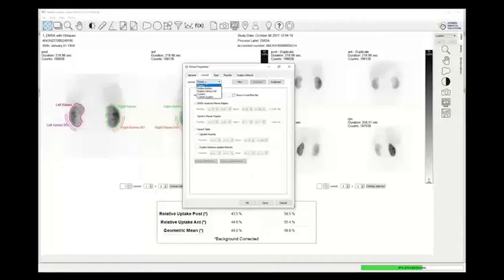As I said, you've also got the option to adjust your font sizes as part of this layout tab. So you can change both the title font, which is here, obviously indicated in bold, and also the font of your actual results themselves.